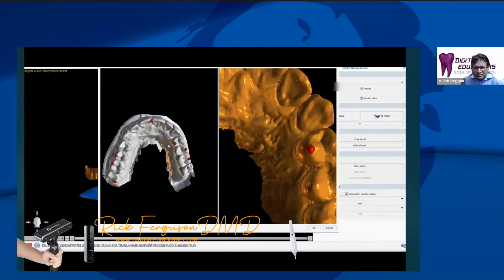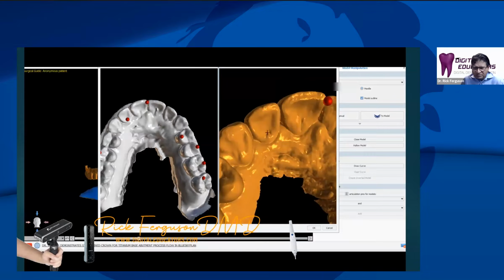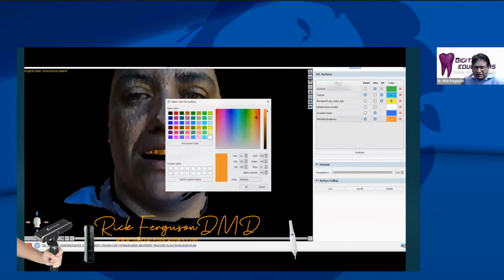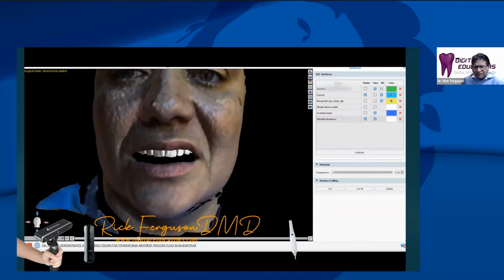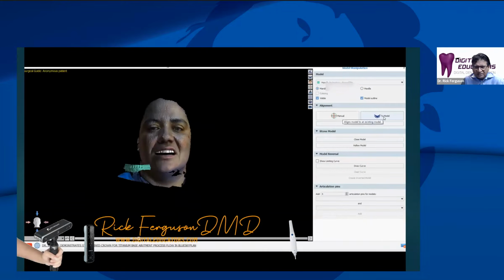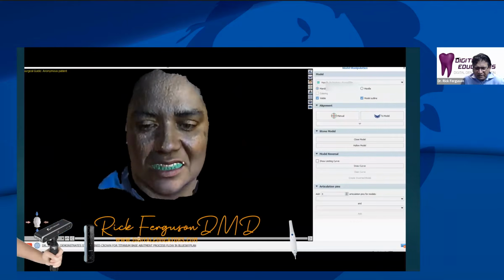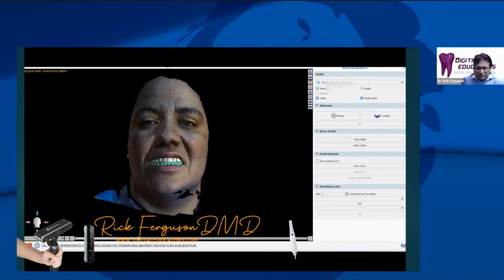And if you want that level of detail, you can then just bring in your intraoral scan and merge that as well, and it will now be aligned the same way to the face. And of course, that can all be aligned to your CBCT. And there you go. And because when you take your intraoral scan, you scan the opposing and the bite, now you can bring in the opposing, and with the automatic functions in Blue Sky, you just automatically align that lower jaw intraoral scan to the upper, and you have the bite relationship.